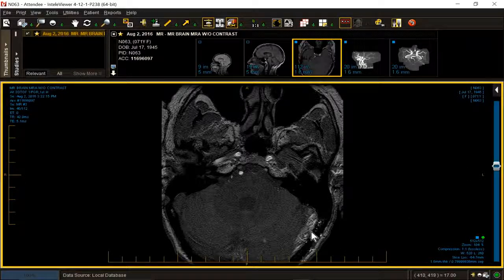Next, is there cortical venous drainage? Next, what's the direction of flow? Is the fistula moving in or is the fistula moving out? And finally, is there venous ectasia? And the answer in this particular case is yes, there is some, although the patient does have relatively large dural venous sinuses. Let's talk about the Cognard classification of dural AVFs.